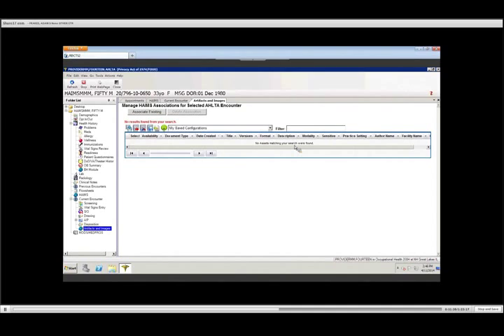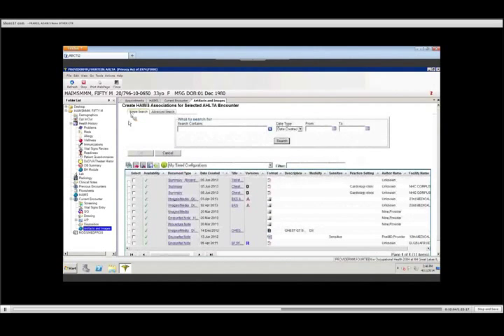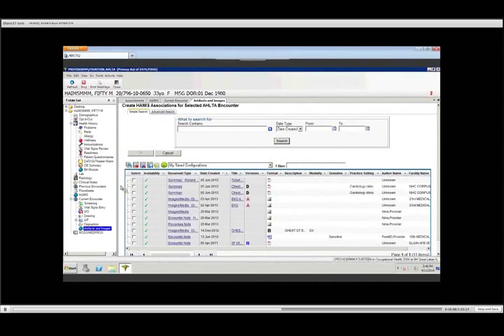But if I've already scanned in, for example, if I'm a cardiologist and I'm working with a patient and we ran an EKG, and I asked one of the techs to upload that EKG into HAIMS, that provider could go into this current encounter and click on the button that says Associate Existing. This will redirect you back to the main asset grid and allow you to choose one or more assets that you want to paperclip or associate with that encounter.